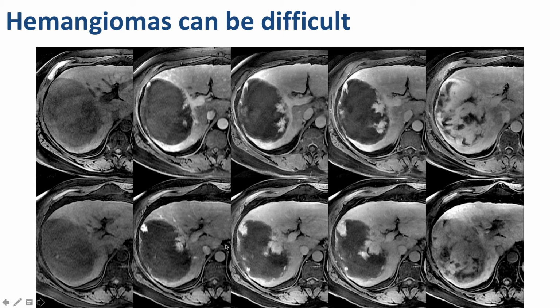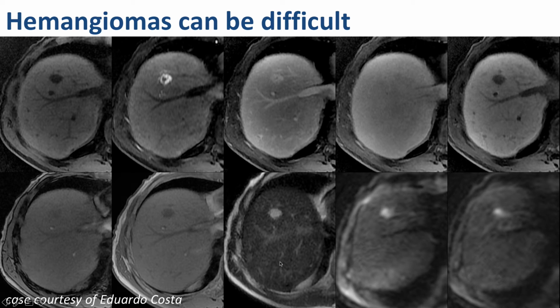With Gadoxetate, they still follow the blood pool, but the blood pool tends to get darker, and so they look darker than liver on delayed images, which can be a little bit confusing. And I know that some of you are saying, well, okay, this case, come on, Claude. I mean, I could get that. Okay, smarty pants. So how about this one?